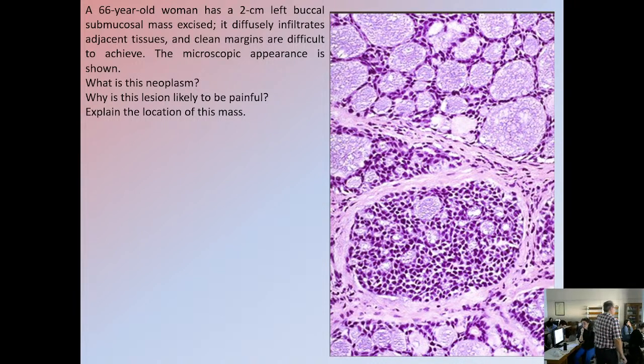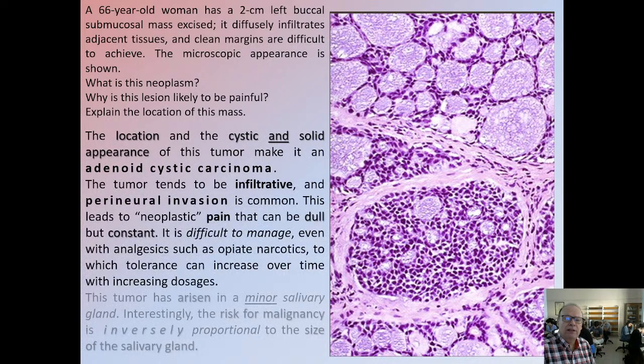How can you be sure that this is a malignant tumor? Since it's not pleomorphic, you have to look for other signs of malignancy, such as nerve invasion. If you see these cells surrounding nerves, this is invasion. So you understand that it's an adenoid cystic carcinoma, and you follow the patient postoperatively very closely. It can give metastasis to the lung and other sites.